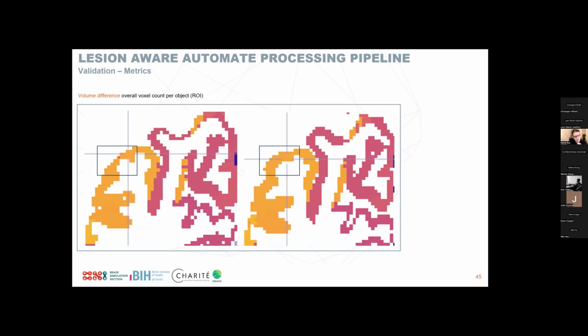For example, here we see this fairly thin region of interest, while we have a much broader mass here. So just counting the actual number, we see a difference in volume, and we can then compare to get an estimate of percentage-wise how much larger or smaller the actual region is.